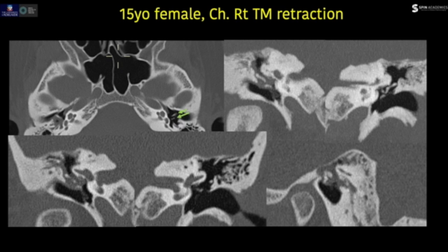Opacification of the middle ear could be due to cholesteatomatous or non-cholesteatomatous conditions. Erosions are commonly seen in association with a cholesteatoma. However, if they were to occur in a non-cholesteatomatous situation, they would tend to involve the long and the lenticular process of the incus and the stapedial head.